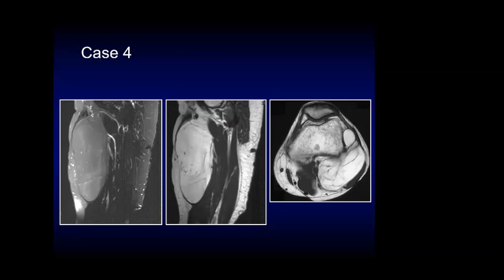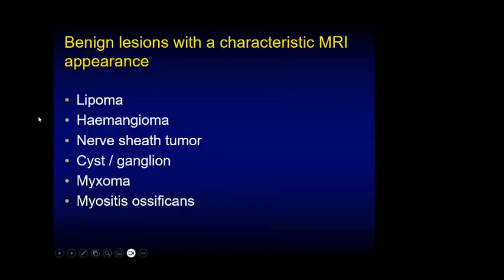There are no soft tissue components, no myxoid components, so mostly it is lipoma. Yes, no other components. Okay, so this is a simple lipoma. And this is what I was talking about, that sometimes MRI scan may be able to give you characteristics of the soft tissue tumor, and you can tell with confidence what you are dealing with.